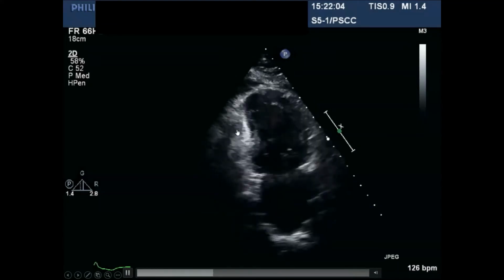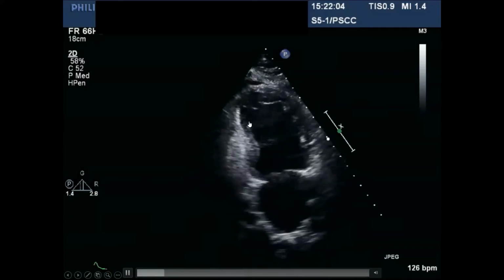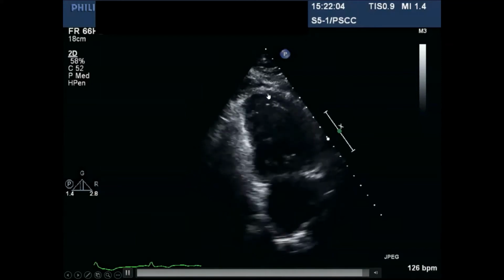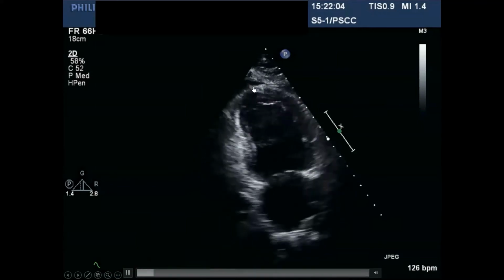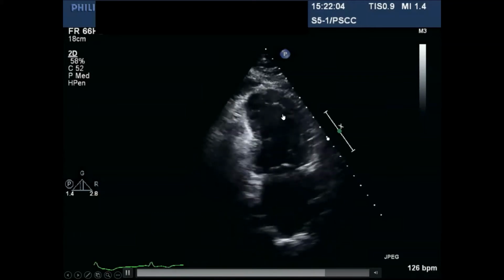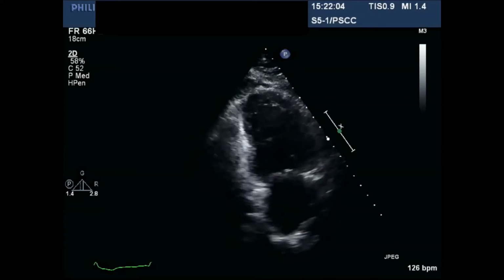So from the mid downward we have what? Hypokinesis. Dyskinesis, actually. If you observe more attentively, you see it gets dilated a little bit during systole. So when the base is contracting, this is bulging out a little, and when it's relaxing, it comes back. So this is a dyskinetic apex, including even part of the mid segments. Any guess? Yes, Takotsubo most likely. It could be Takotsubo. Exactly.